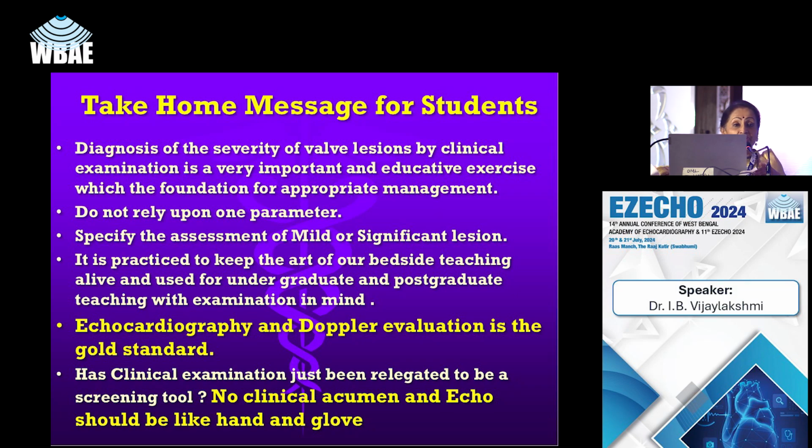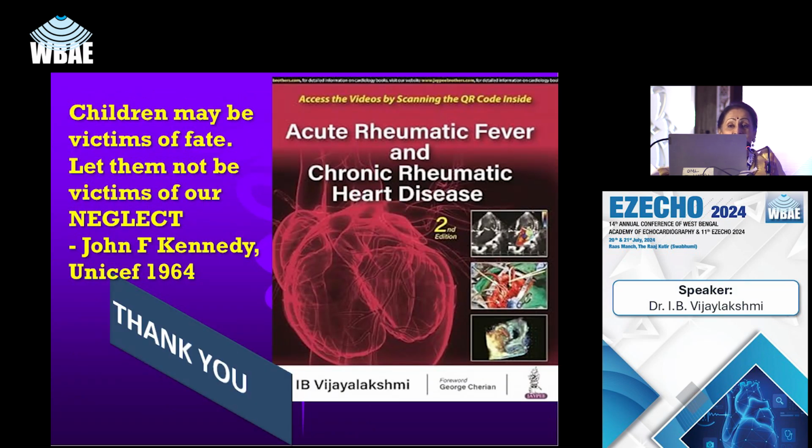So in this patient, the surgeon can take a call whether it is a direct suture annuloplasty or a ring that has to be put for the tricuspid valve. If you look at the natural history of the TR, whenever the annulus becomes dilated, the patient has to be treated. So in our case, first option is balloon dilatation, that is PTMC, plus transcatheter valve replacement.